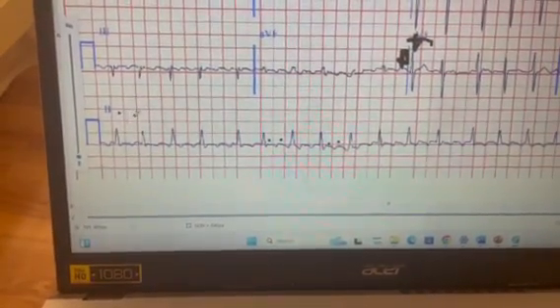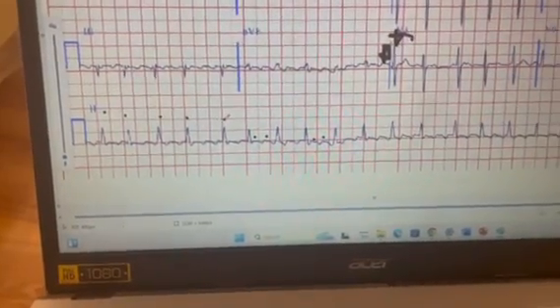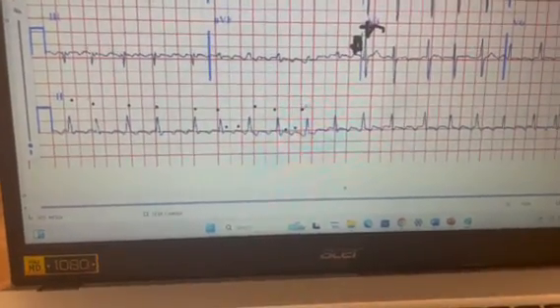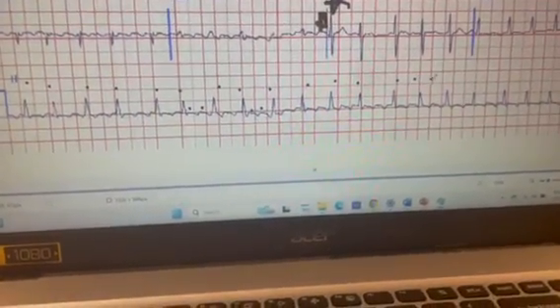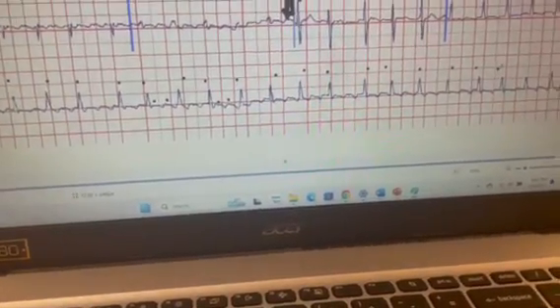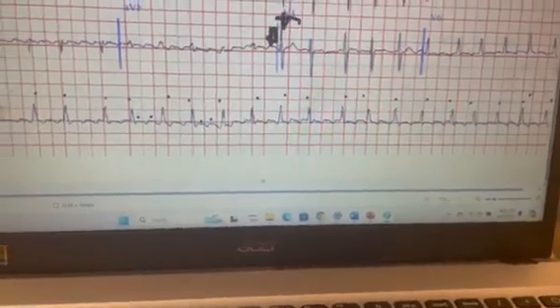So 1, 2, 3, 4, 5, 6, 7, 8, 9, 10, 11, 12, 13, 14, 15, 16, 17, 18, 19, 20, 21. 21 R waves.